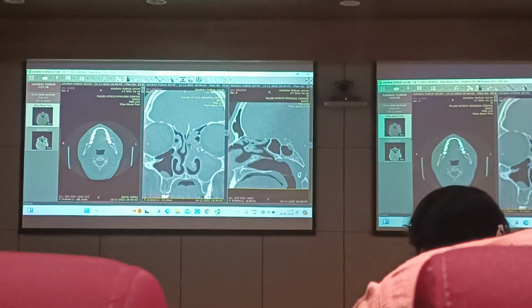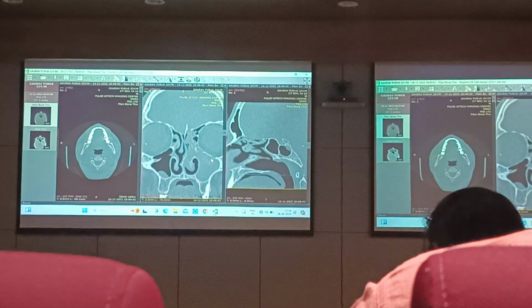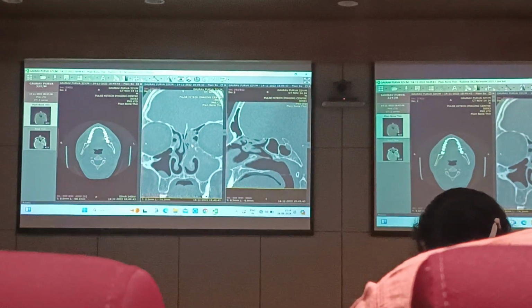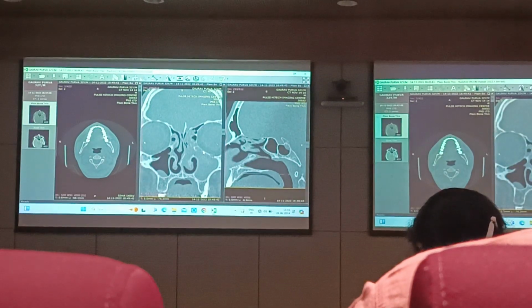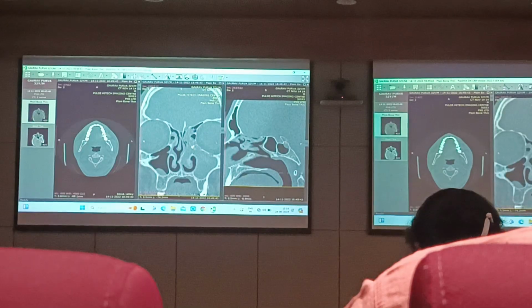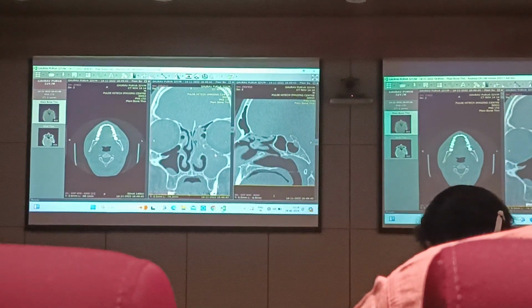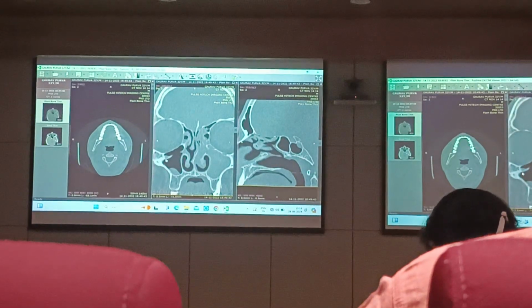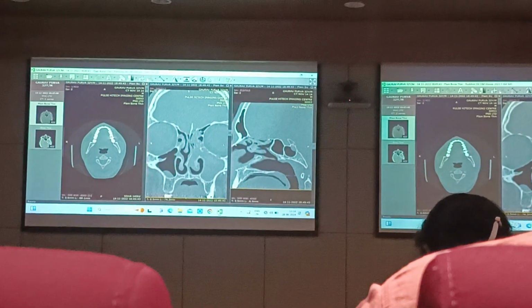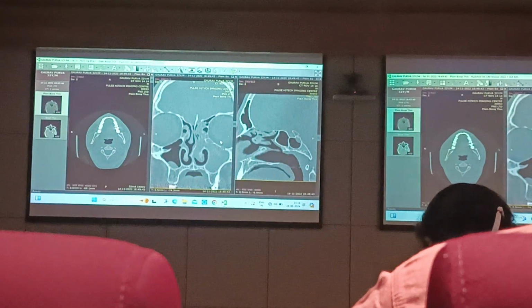You're seeing the maxilla completely obliterated, right? Ethmoidal disease will have secretions in the maxilla, and will have bilateral huge polyposis with both sides of the maxilla filled up. Correct? So this one, with the widening of the ostia and this sort of picture, she said is an antrochoanal polyp. You said it is allergic fungal. Allergic fungal generally involves both sides, but this could be a fungal ball. Fungal ball, correct. Not allergic, but you could say fungal ball, right?